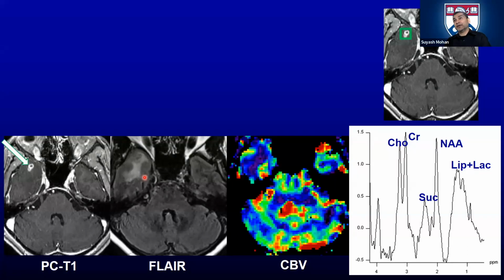And so the neurosurgical team was activated and she was all set to go to the OR the next morning, right? And so for these kinds of new tumor diagnosis cases, we get all these kinds of spectroscopies and CBVs and all the advanced sequences. And I was looking at it, I saw something, and I called the surgeon. It was Dr. Brem. I said, Dr. Brem, I don't think that this is mets. I think you should cancel your OR, right? I think it is a parasite.